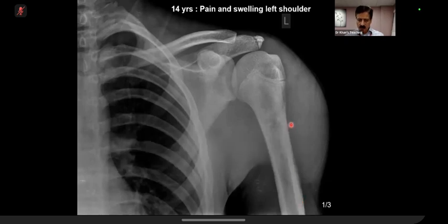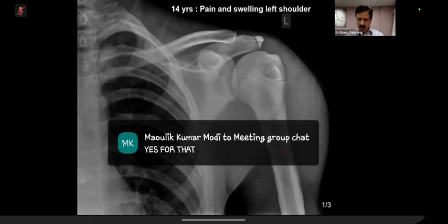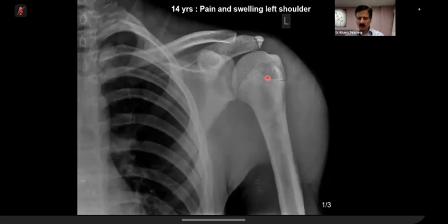Look at this. This is the cortex. This is the cortex. First of all, something is here, right? Then you look at the medullary cavity. Look at this medullary cavity. As we go in, look at this medullary cavity. There is something wrong. Even if you pick up that I am a bit worried and something is wrong, actually there is a bit of permeation, look at this pattern. It doesn't make sense. And with that, the soft tissue.